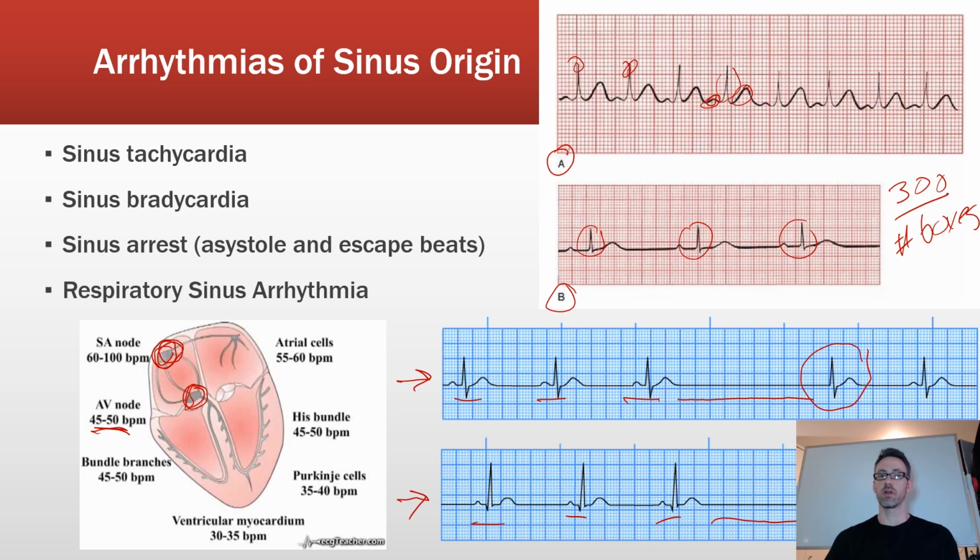So the heart rate goes up when they breathe in and goes down when they breathe out. And so this is what we call a respiratory arrhythmia. So they breathe in, it speeds up, they breathe out, it slows down, and you can kind of notice that pattern where there'll be clusters where it picks up speed and then slows down again and picks up speed. And you'll notice that if it correlates with their breathing, then that's what you have.